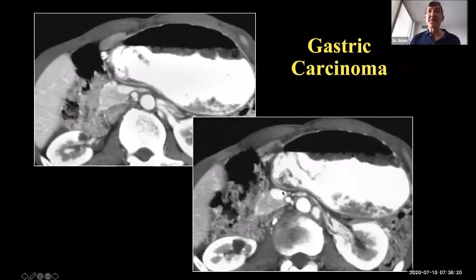But we can also think about where else it might go. And again, if it's spreading immediately through the gastrohepatic ligament to the porta, where else might it go? It's circumferential. And that diagram told us, of course, it could be draining through the gastrocolic ligament. And does anyone see the disease in the gastrocolic ligament?